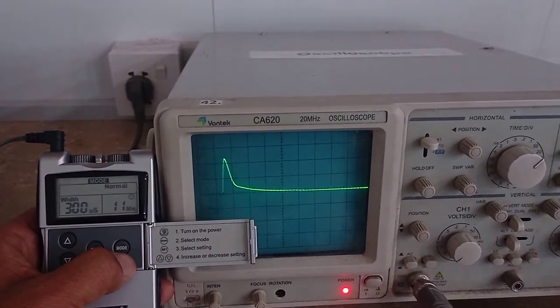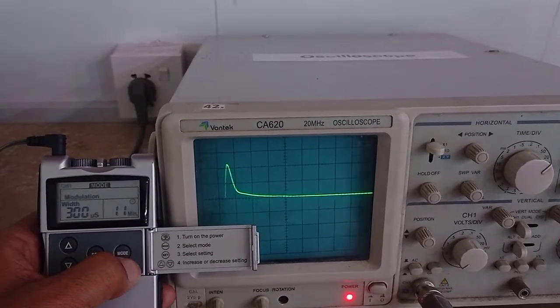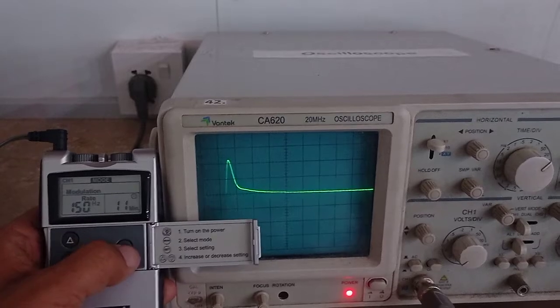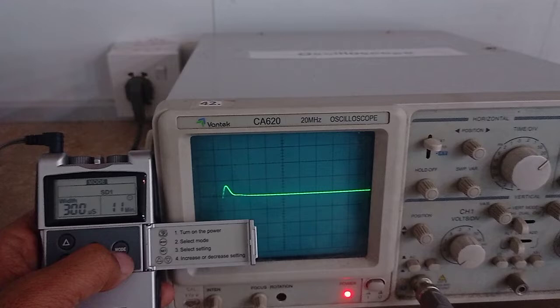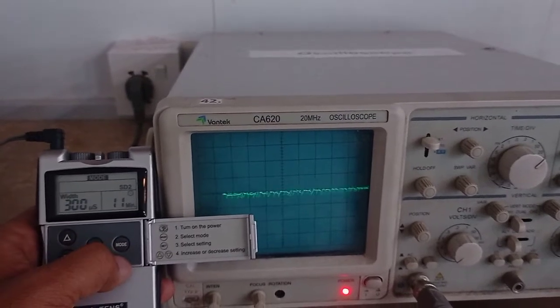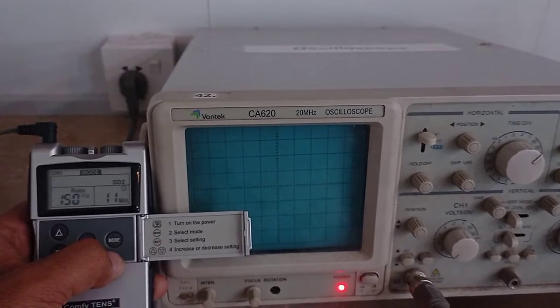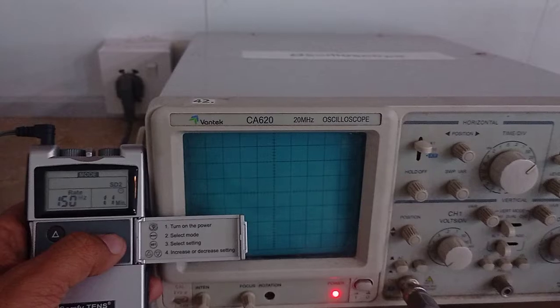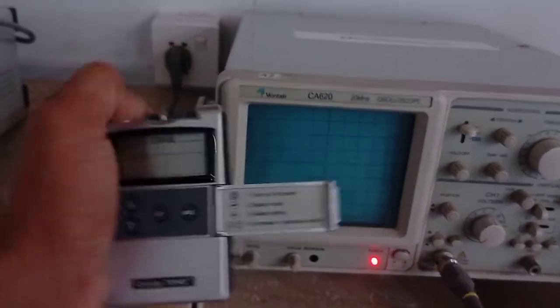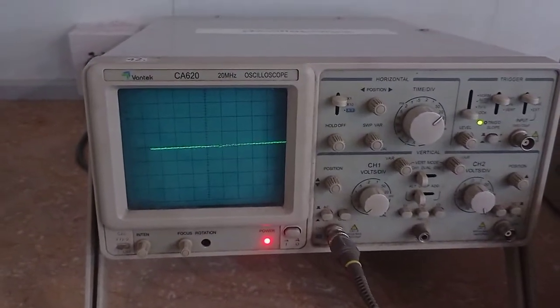normal is sustained, modulation is when the waveform is jumping up and down, up and down, and strength duration 1 when it goes up like a wave and goes down in a slow manner, and strength duration 2 is when it goes up and down very fast. And if I turn this unit off right now, there is no such activity onto the oscilloscope.